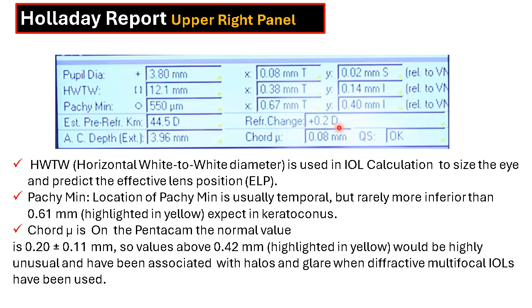For example, this patient has plus 0.2 diopter, which is very negligible, so it is unlikely that he has undergone any keratorefractive procedure. The AC depth external is the width of the anterior chamber from the corneal vertex, that's from the epithelial side, up to the anterior surface of the lens. This is also used in some IOL calculations, especially for phakic AC IOLs.